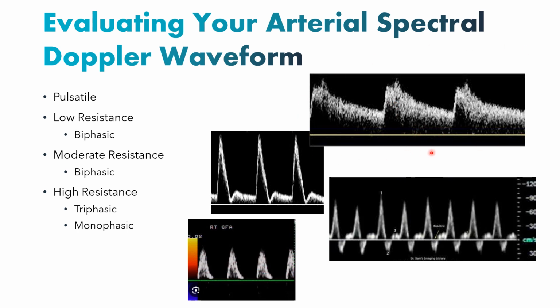This is the type of flow that you might expect to see in the splanchnic vessels of the abdomen. So in your superior mesenteric artery can be complicated because it depends on your prandial state. But let's say the spleen, let's say the liver, this is classic for an ovary, a testicle, anything that's going to have very low resistance flow.